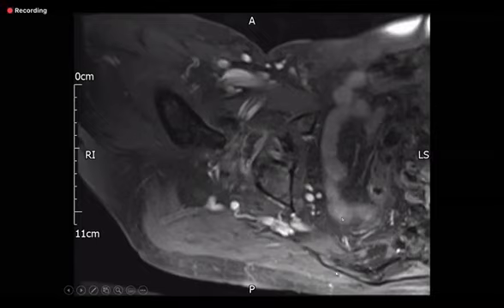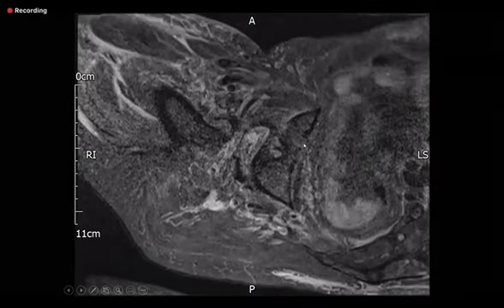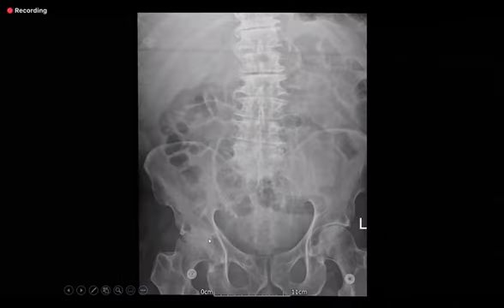Okay, you keep the mouse, but I am going to just, okay, so well done. If you see here, look at the findings. Now the key finding here is, as was pointed out, that the joint space is lost, but then look at this, look at the margin. This margin is lost. Now that has to be pointed out. Similarly, there is a bit of depression here and a bit of lucency here. So these things then become suspicious.